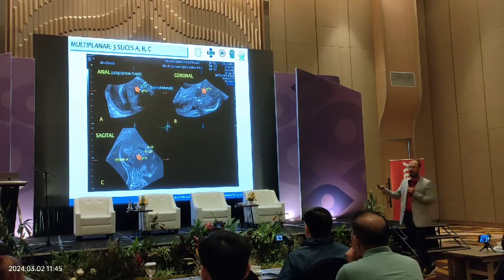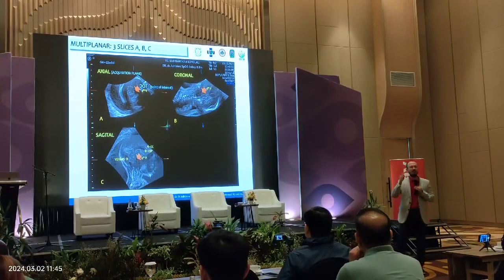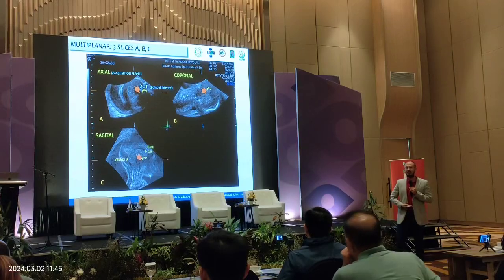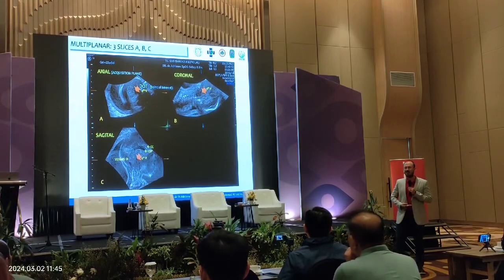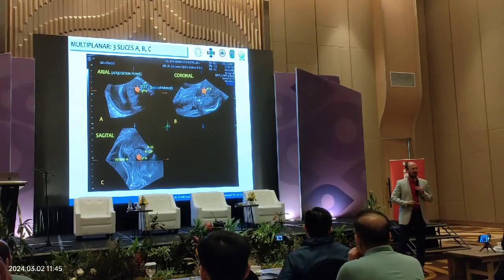Yesterday, I told you how hard it is to find the sagittal plane when doing abdominal sonography, because of the positions of the fetal head, whether head presentation, breech presentation, or transverse lie.